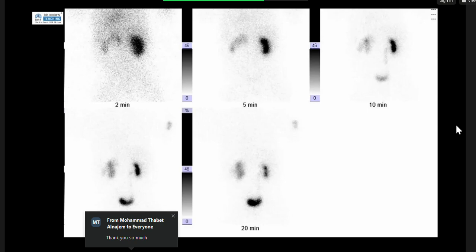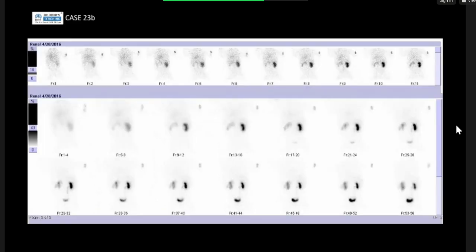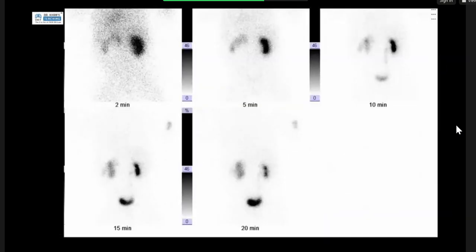So this is the original scan. Oh crap! Thank you. So I got my rights and lefts confused, so apologies. So this is the PUJO case. There's the initial one, and then this is the one that shows you just spot images, which is probably a lot easier.